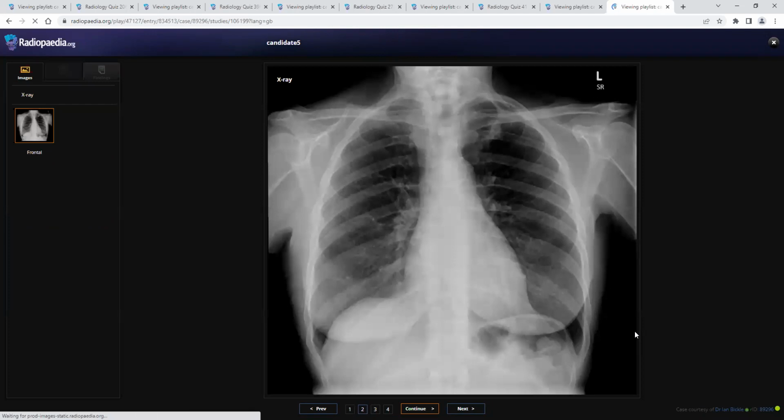So I've been provided with a frontal chest radiograph of a female patient who has bloating and pain, and there is iron deficiency anemia. I am looking at both lung fields. Both lung fields appear grossly unremarkable. The cardiomediastinal outlines appear preserved. Bilateral costophrenic angles are clear. There appears to be slight opacity in the right apical zone. However, this could possibly be projectional.